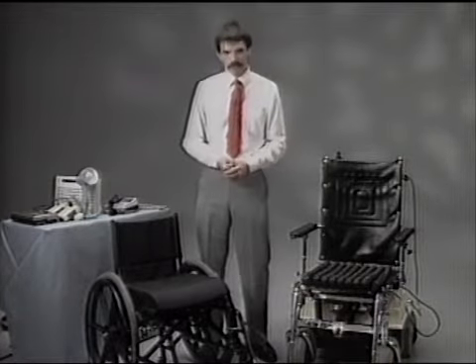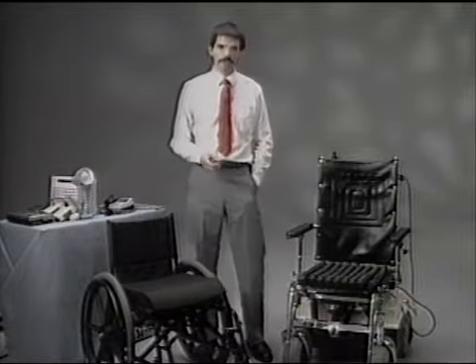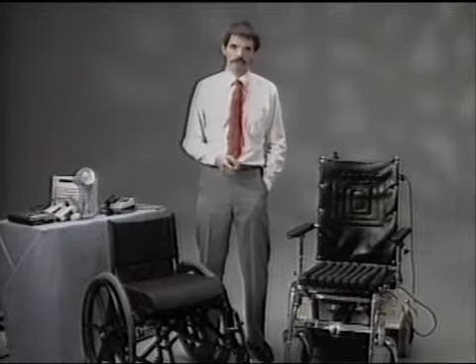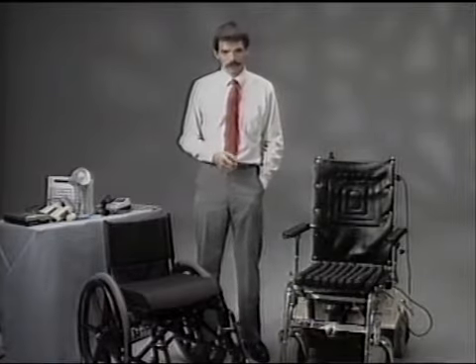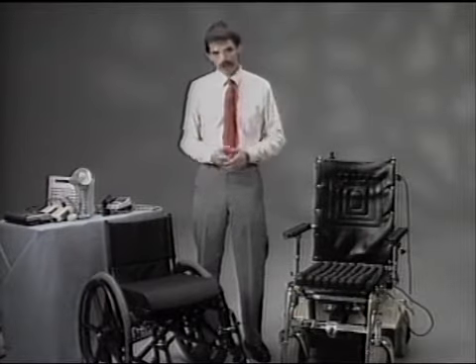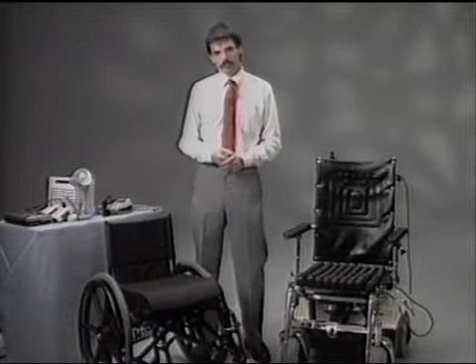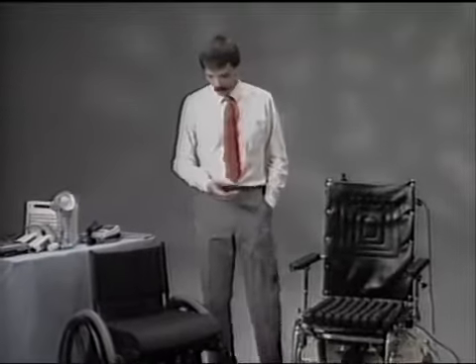This is black. In fact, they come in almost any color you can imagine, and there's a reason for that. Wheelchairs tended to be stainless steel because the manufacturer of wheelchairs happened to have a large business in chrome plating, and that seemed to be the color that looked most hygienic in most institutions. But now people wanted to be able to choose the color of the wheelchairs. Most of us choose the color of the clothes we wear. We choose colors that match us, that we like to wear, that look good on us. We don't wear stainless steel pants and stainless steel colored shirts. We look at clothes that really make us feel good about ourselves.